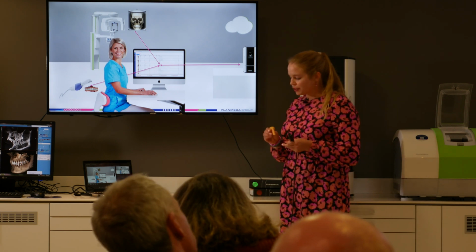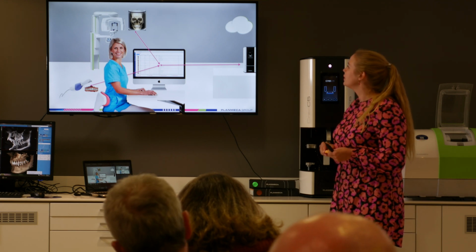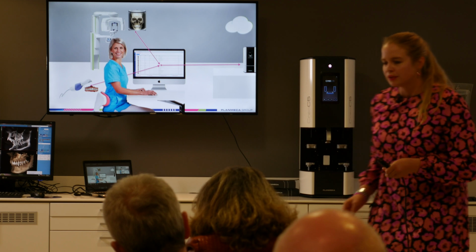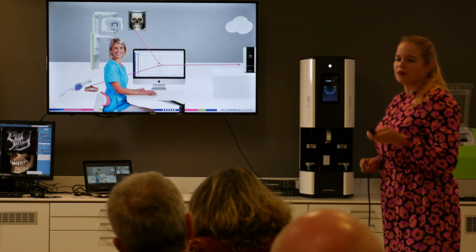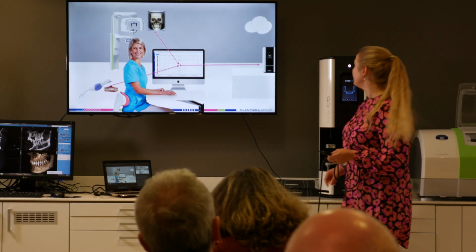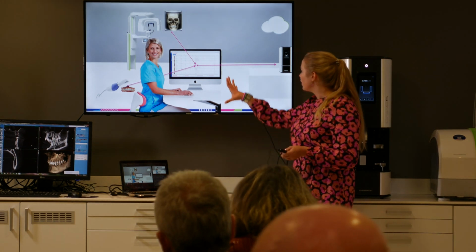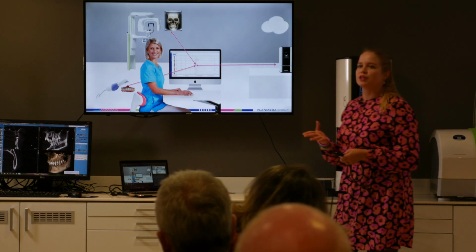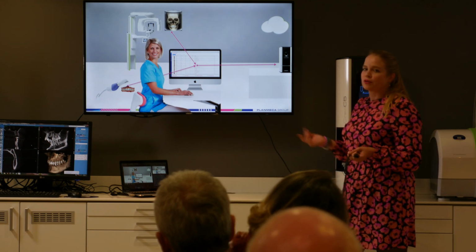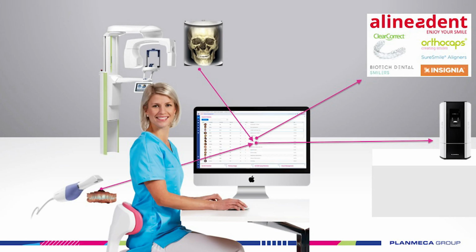Then if we would be interested in actually making virtual setup of the teeth, so designing in which positions the teeth would be moving, and for producing in-house clear aligners like this, I can also give that to you. So that's a dental model on top of which the clear aligner is produced by pressing a membrane on that. So by capturing the dental scan, we can design those aligners or the model series that would work as basis for clear aligners in Romexis, and we could print those models, for example, with our Creo C5 and produce the aligners. Or then another option would be, of course, to send them to some manufacturer to produce them.